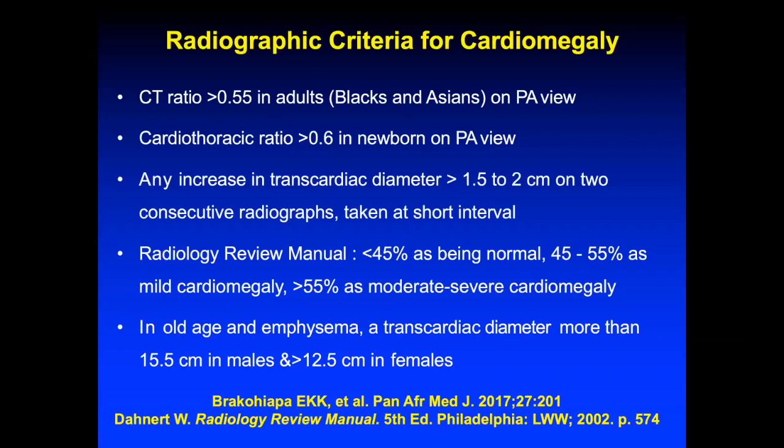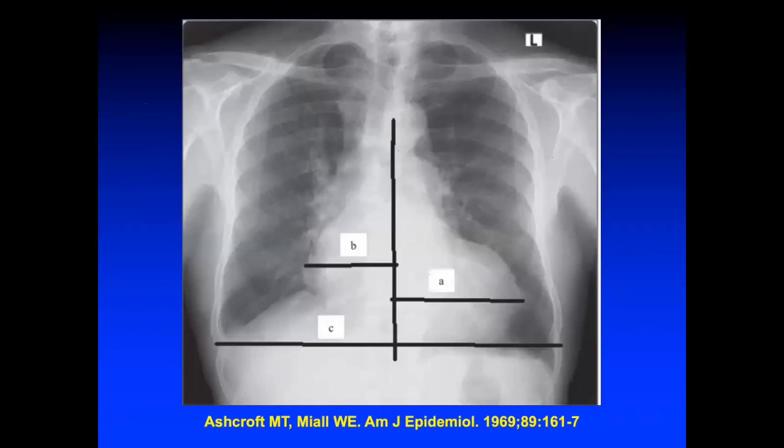If someone asks you what the severity is, this is the only classification I got in the literature: can you classify the severity as mild, moderate or severe cardiomegaly on the basis of cardiothoracic ratio? Again, a very simple example: draw a vertical line, the maximum cardiac diameter on the right side and on the left side, A plus B, and the maximum thoracic diameter. Here they have just drawn R to the outer area. This should always be the inner area.